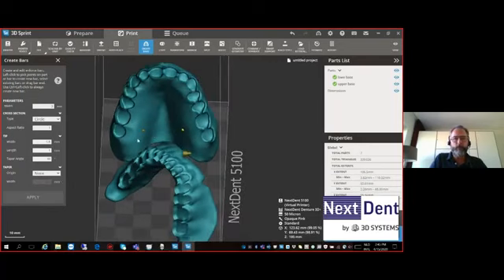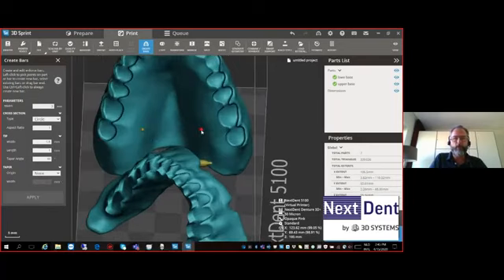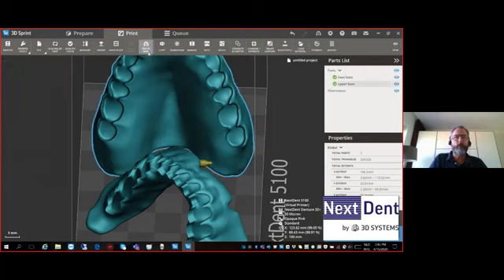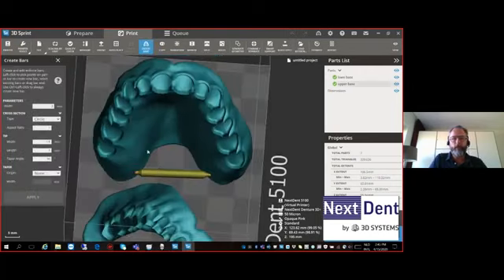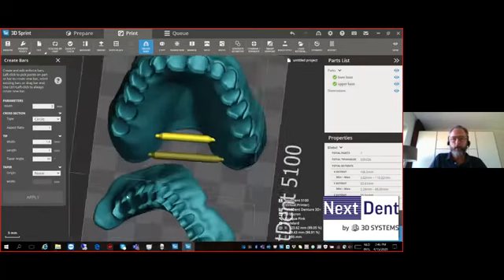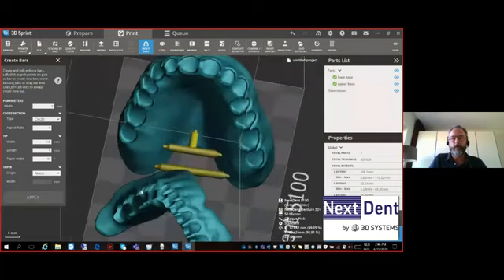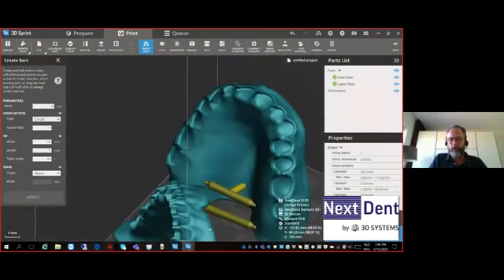let me see, why is this not working? If you want to undo something, you can just do this. So I will undo it quickly because something is not working as planned. Let me see here, now we can see apply. Like I told you, the software is not yet released, so probably this is why we have some slight problems here. Now it's working. And we see that we need one more.